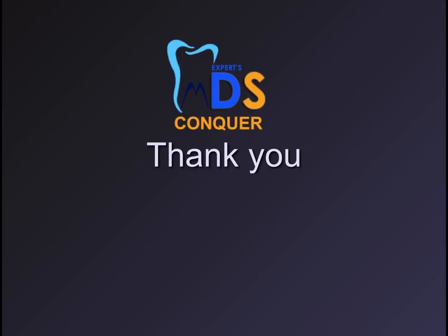So first, have a good idea of all the important landmarks and the confusing landmarks as well, and also the different types of images that are presented in an OPG image. Followed by that, go to some abnormalities or some lesions that can be presented in an OPG image. So you need to practice to give a radiographic diagnosis. That needs a little practice, but yes, if you go through a lot of images, then it will be easy for you to arrive at a correct answer.